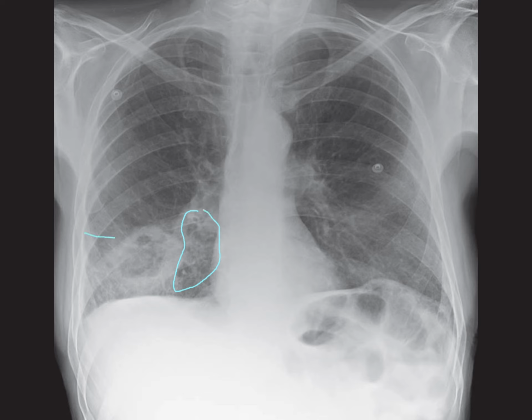When I encounter such a finding, my immediate next step is to review any available previous imaging for comparison. This helps in understanding whether the finding is new or stable, which significantly influences the differential diagnosis. Given the appearance of the lesion, particularly the thick wall and air fluid level, I'm concerned about a cavitating lung neoplasm, possibly a bronchogenic carcinoma. This finding warrants urgent further investigation, including a referral to a respiratory specialist for bronchoscopy and a staging CT scan.